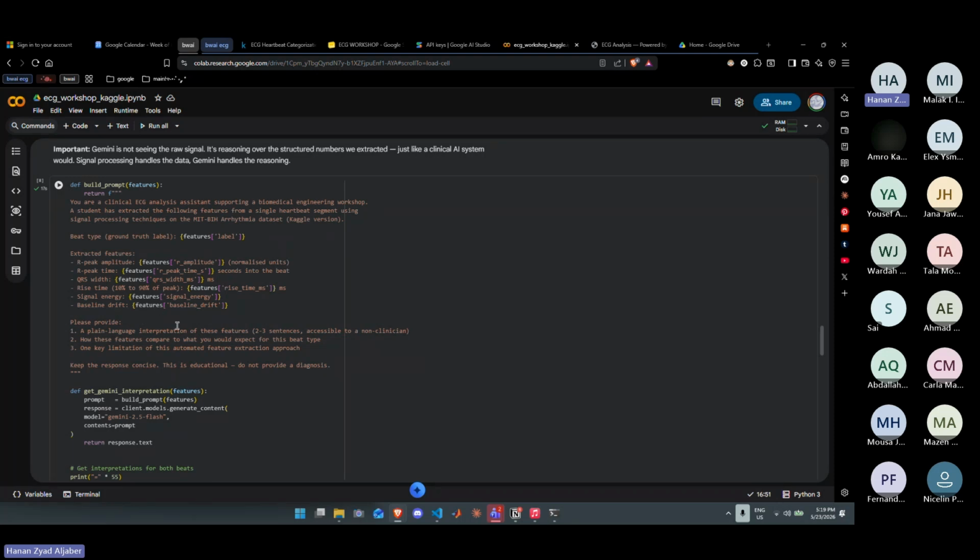So this text here, over here, it's the entire string. It's the engineering, basically. The way you phrase this, what you ask for, the structure of the output, that's what you're designing. So changing this prompt would change everything, and it's really important.